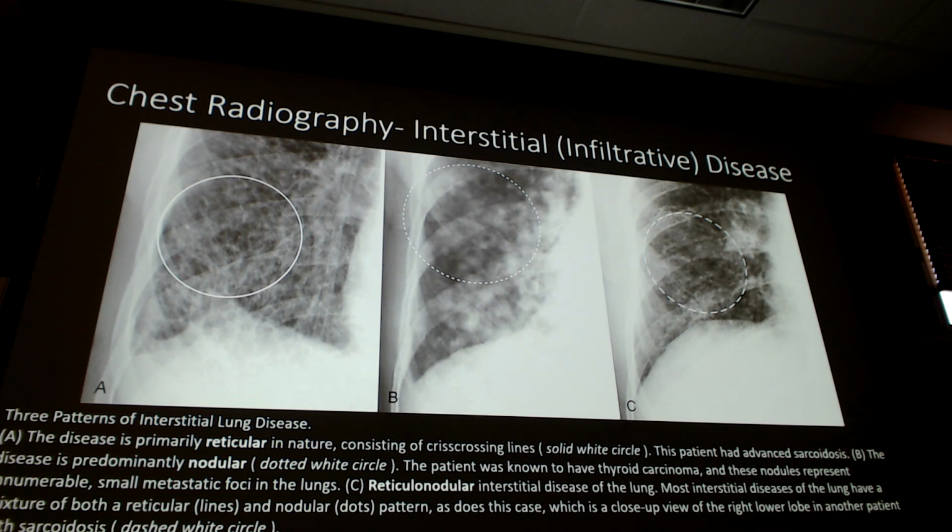This is what this looks like. Okay, I'm not going to make you do that just off of an x-ray. It's not one of the disease processes we talk about specifically with its own topic slide. It's not something I'm going to have you try to pull out, but you will see sarcoidosis again in Pulm. Okay? Now we go into our middle one, which is nodular.